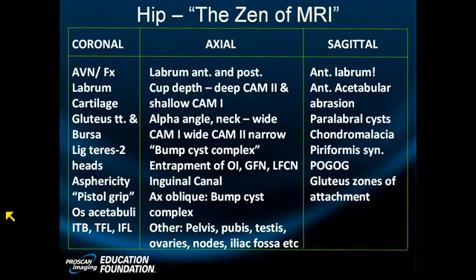There is no soft tissue swelling. So you may simply be seeing a prominent complement of red marrow. Let's keep going, shall we? Now I've put up the short axis views.